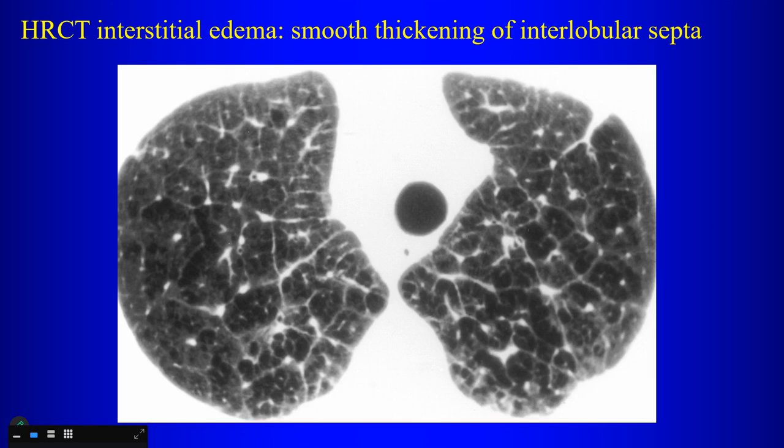There is a condition where we do start to see the central lobular bronchioles. What is that? Whenever there's inflammation, the central lobular bronchiole might fill with pus, and what pattern does that give you on CT? Tree and bud. So that tree and bud pattern that you see on CT represents the central lobular bronchioles that are somewhat distended, filled with inflammatory secretions. Also, when you have inflammation around the central lobular bronchioles, we can also see the inflammatory changes around it on CT.